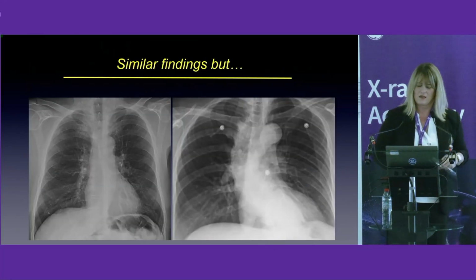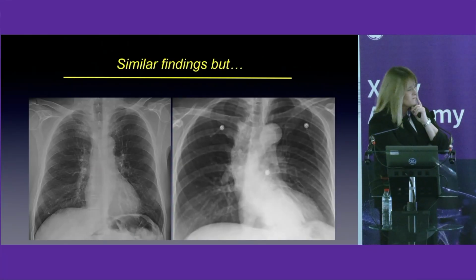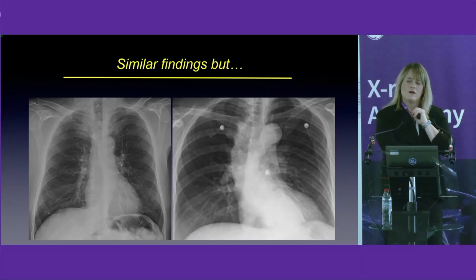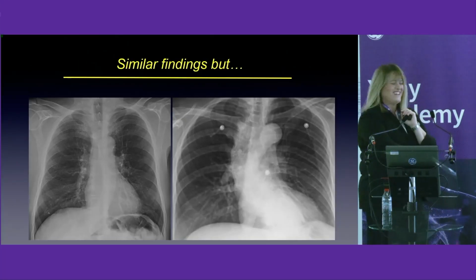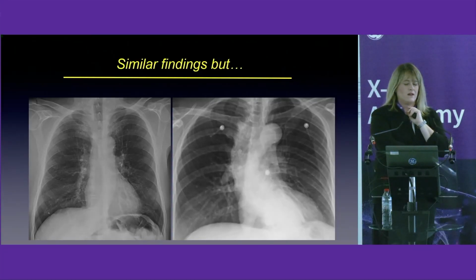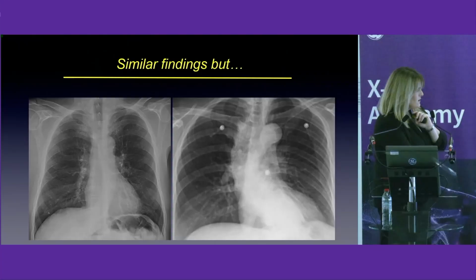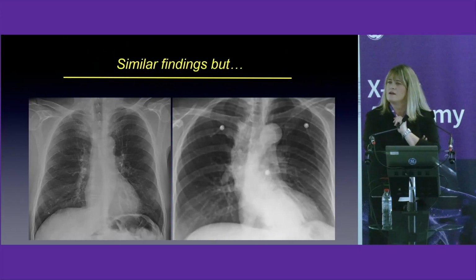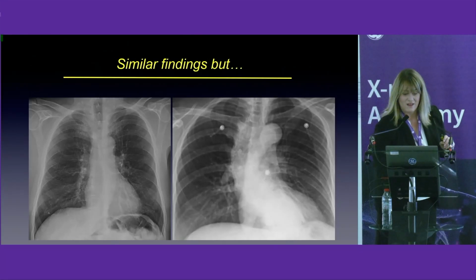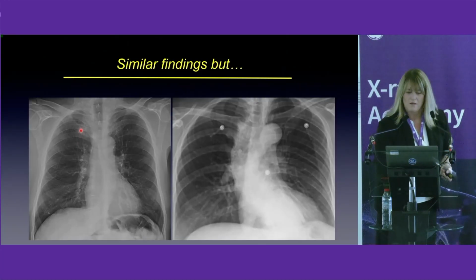And what about this? Two different patients. Is there anything wrong with them? I guess yes, but what? Where? Down. Yes, in the paramediastinal areas. Here we have an increase in opacity in both patients, here and here.